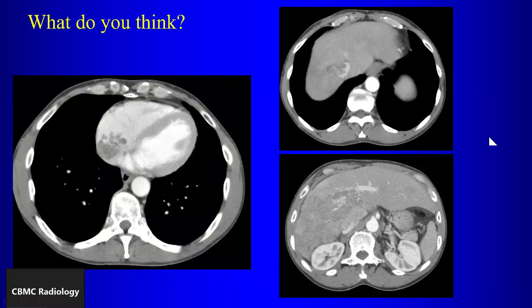Okay? Dr. Mel, I know thrombus doesn't enhance, but does tumor thrombus enhance? Yeah, so tumor thrombus can enhance. So if you have pre and post images, you look for enhancement, and then that tells you that it's tumor thrombus as opposed to bland thrombus, that it contains tumor in it. All right? So this should be familiar to everybody who's done CT here.